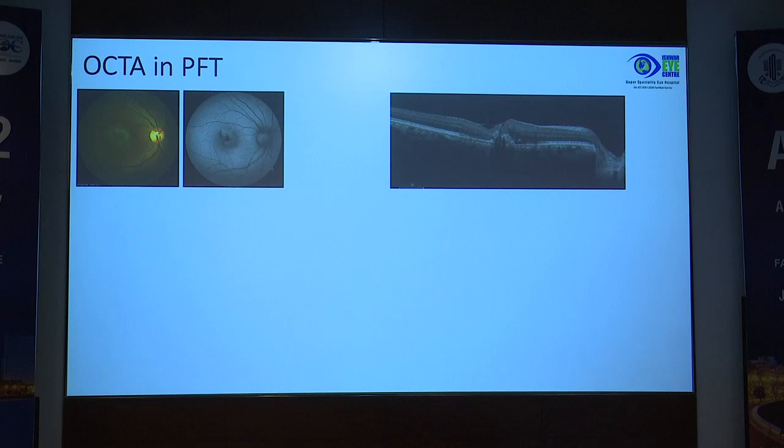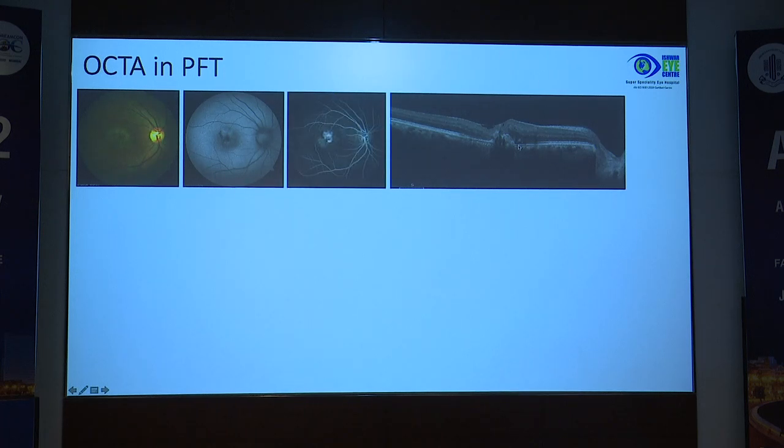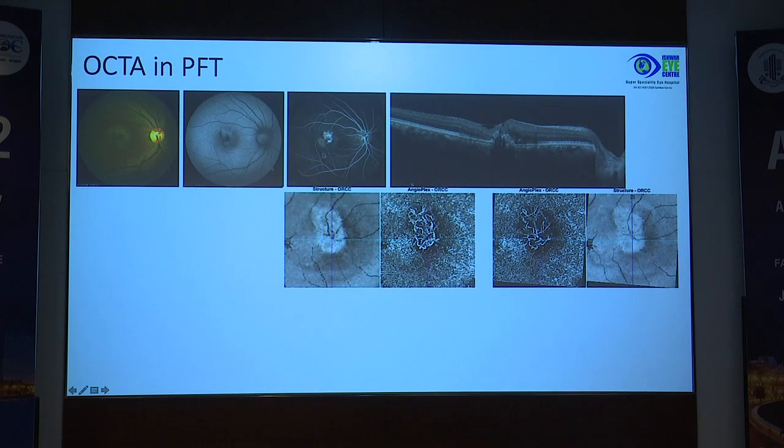Again, a similar patient, 45-year-old lady, post-anti-VEGF, presented with metamorphopsia and some amount of subretinal fluid here you can see. Of course, the FFA is quite diagnostic in this. It is showing you the leakage, but it is the OCTA which shows you the membrane and gives you the confidence. You can see the beautiful membrane here, and this is after 3 anti-VEGFs.